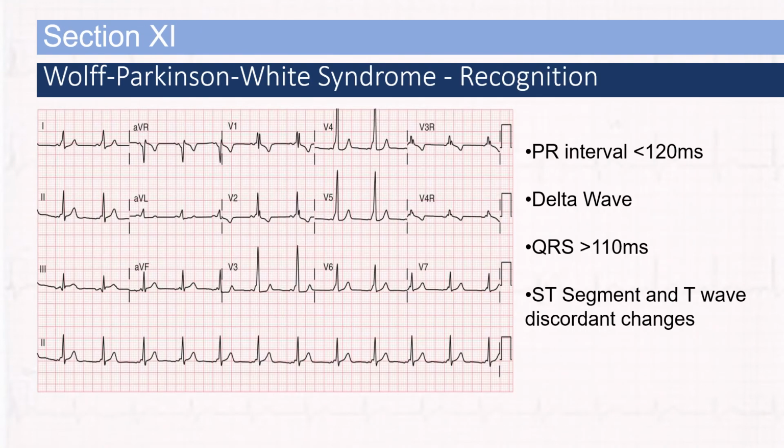The last 12 lead presentation we're going to go over in this presentation is Wolff-Parkinson-White syndrome and how to recognize it, and more importantly, how to treat it. Wolff-Parkinson-White syndrome rolls in all of what we have learned on all four parts of this presentation.